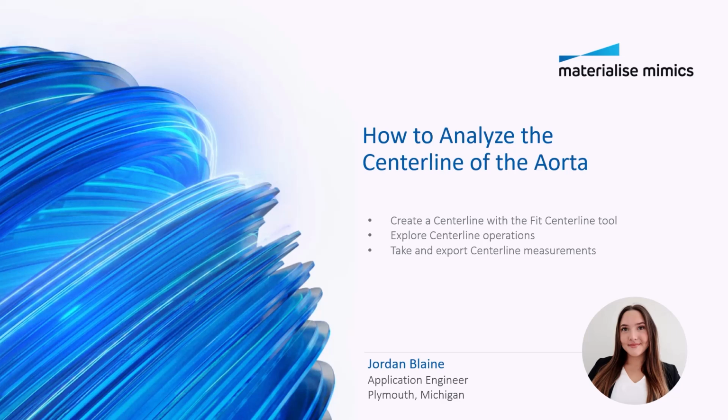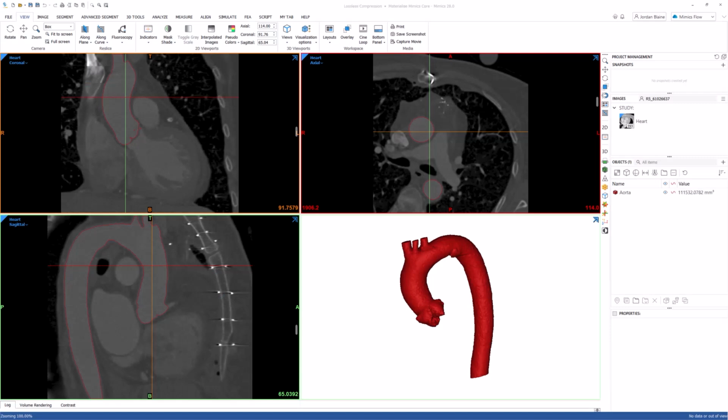In this tutorial, I will show you how to analyze the centerline of the aorta using the updated centerline tool in Mimics Core 28. We'll go step by step through the process of fitting, refining, and measuring a centerline, as well as exploring the features of the improved centerline tool.